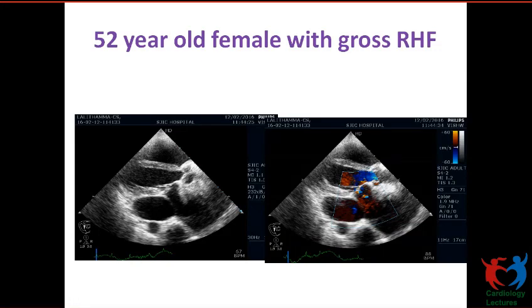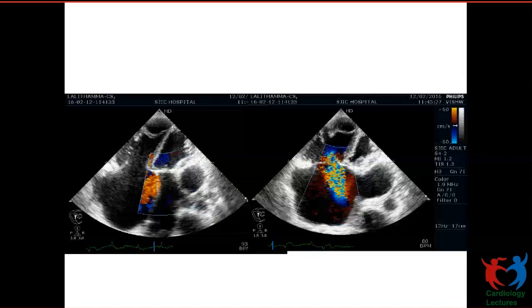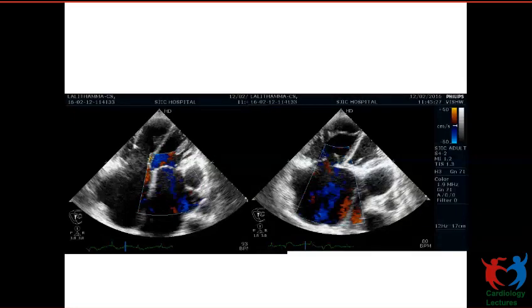And pericardial cyst can come there. And that last circle, what is that, madam? Behind the left atrium? This may be artifact; you have to see in other views. Sometimes dilated pulmonary artery comes.